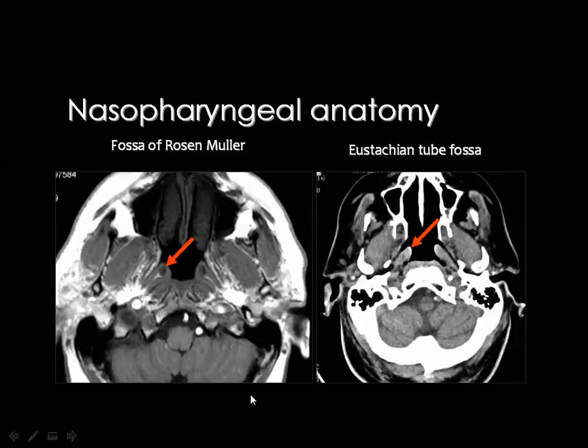Then, if you look to the pharynx, or the medial mucosal space, there is a difference between the naso and the oropharynx. Both are seen on the medial aspect of the parapharyngeal fat. On the nasopharynx, you see a very important anatomic structure which is known as the torus tubarius. And this torus tubarius is made of two muscles which are seen best by MRI, separated by a very small fat plane. This is the torus tubarius, and these are the two muscles, the tensor and levator veli palatini muscles.